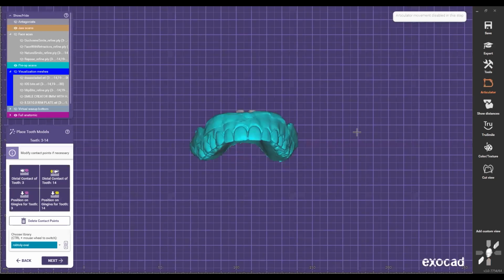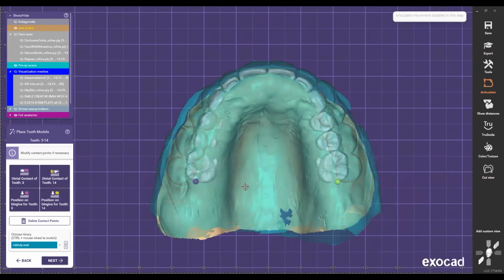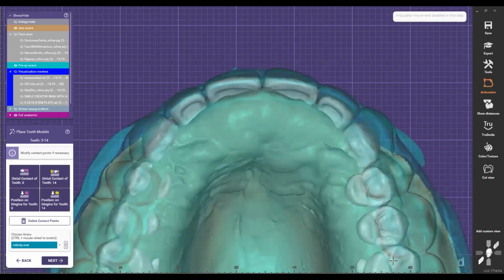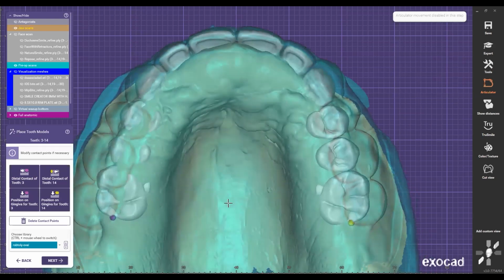So what I'm going to do is make this transparent, and then start moving this, and try to follow. See, from here, I can kind of tell if I like that height of that tooth. I'm just going to try to preserve that right there, right? When I'm scaling it, all the teeth are going to scale at the same time to the right dimensions, following the centrals. So I don't have to worry about scaling here and scaling there, because I don't want to change that.